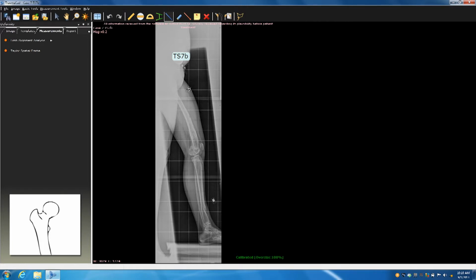And for a Coke or a beverage of your choice, how did they position this patient incorrectly? They did one simple thing wrong. What was that? Externally rotate, they could have done a little bit more, but why are you seeing the other leg? Yeah, because they did one of these, so they have this leg, and the x-ray tech just let them stand like this, and they have to stand like this.